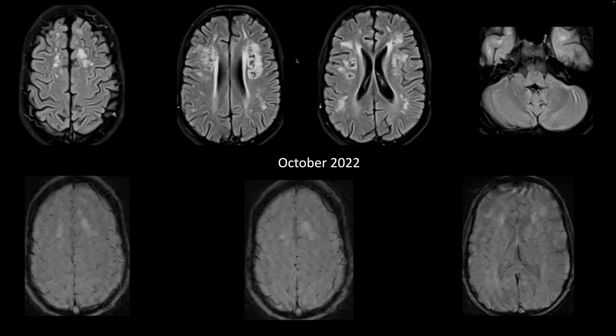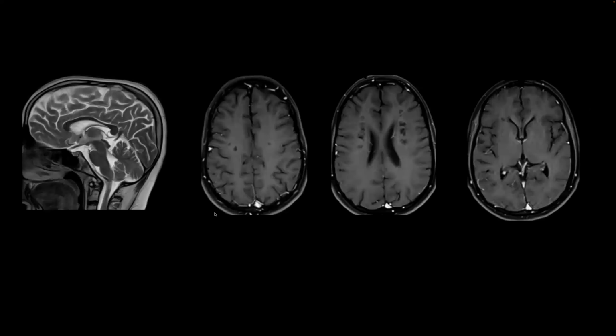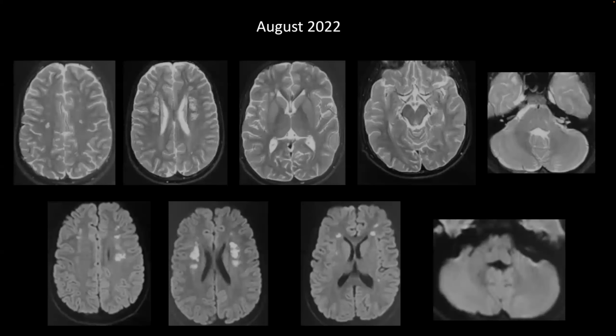Do we think any of it is calcification? There are no calcifications. They're just very unusual changes. It doesn't look like demyelination. Did we say there is spinal cord involvement also? No, there's no spinal cord involvement. Okay. So anything in the eyes? Nothing on the imaging.